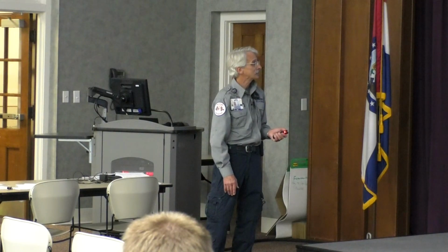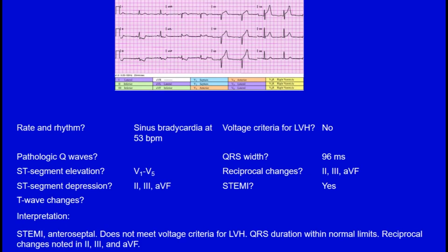Maybe there? I don't know. Let's see if they say that. They do not. Okay. All right. So, anterior septal STEMI.